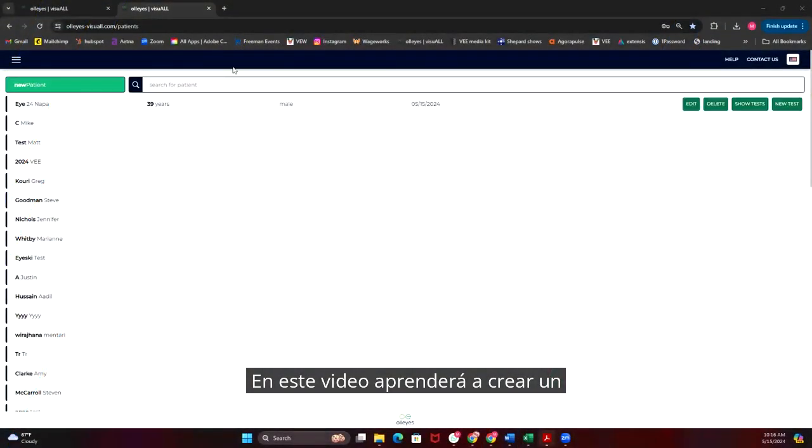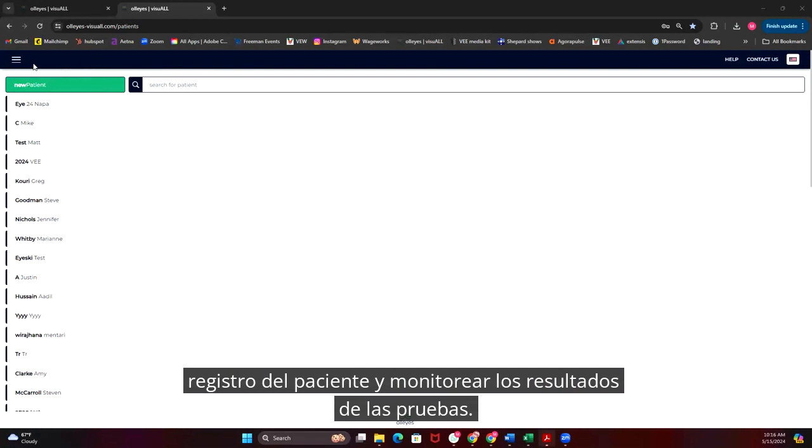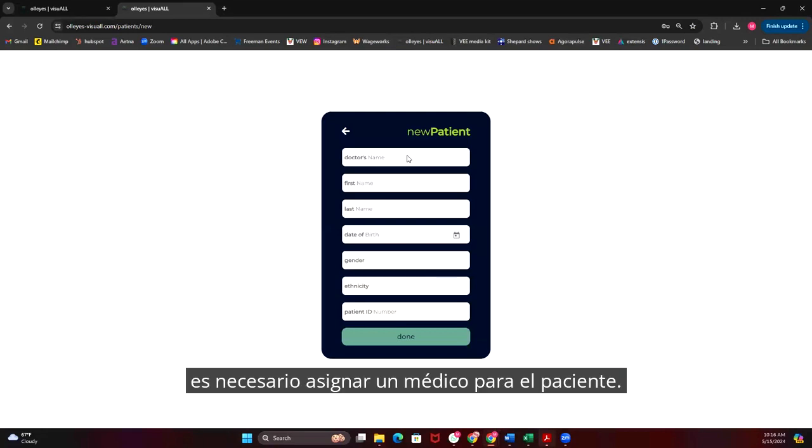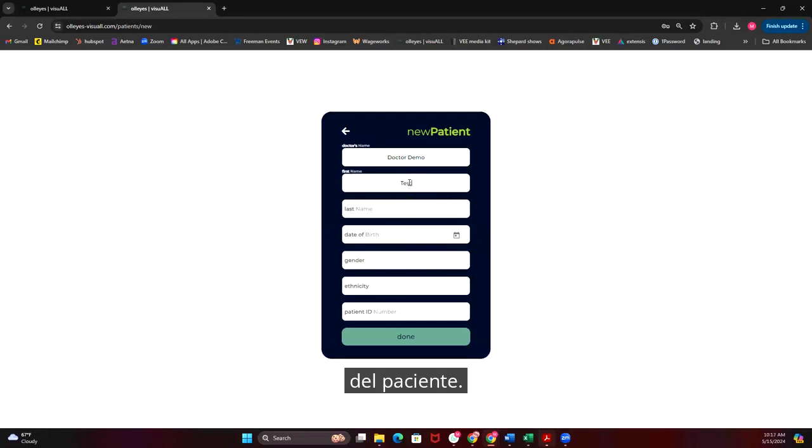In this video, you will learn how to create a patient record and monitor test results. To start, click on New Patient in the main menu. You need to assign a doctor for the patient. Complete the patient's basic demographic information.